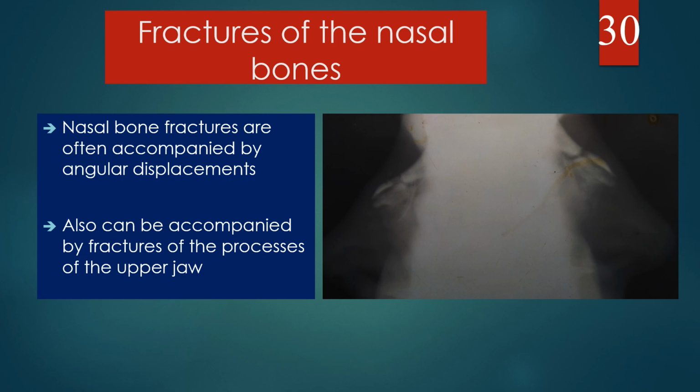Fractures of the nasal bones. Nasal bone fractures are often accompanied by angular displacements. Also can be accompanied by fractures of the processes of the upper jaw. Here are two lateral X-ray films with the presence of fractures in nasal bones.